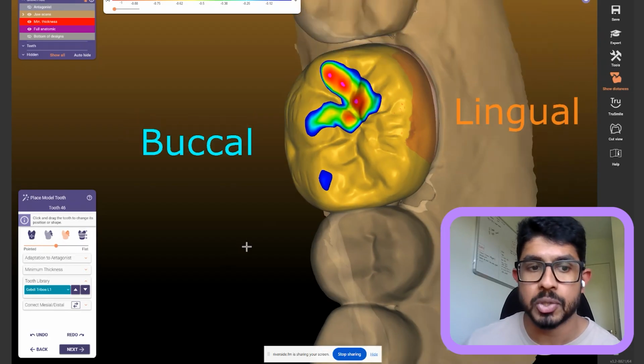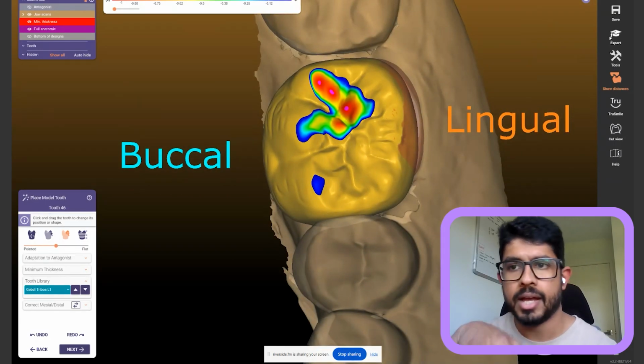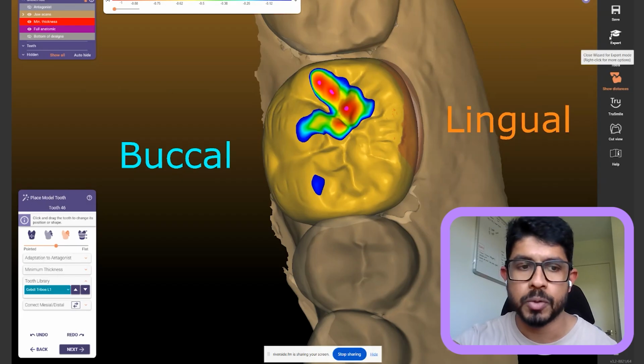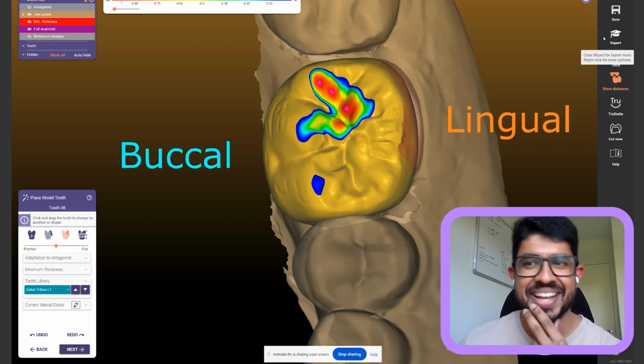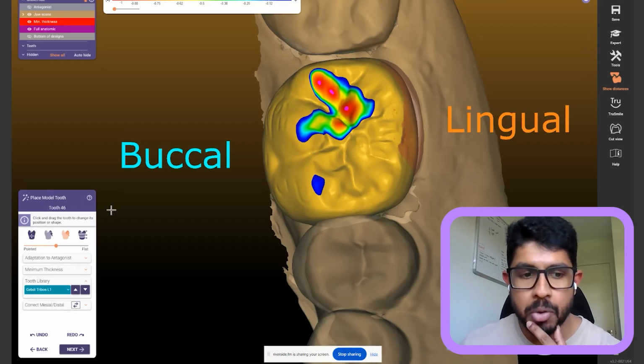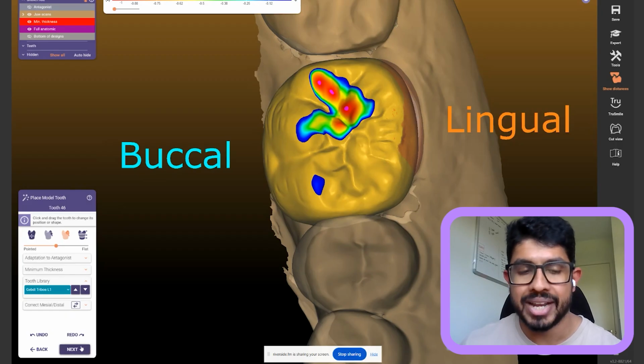What I personally like to work in is something called expert mode. Do you know the difference between wizard and expert mode? Please tell me. Wizard mode is where you have pop-up prompts like this that come up in every single step, and you go next step, next step.